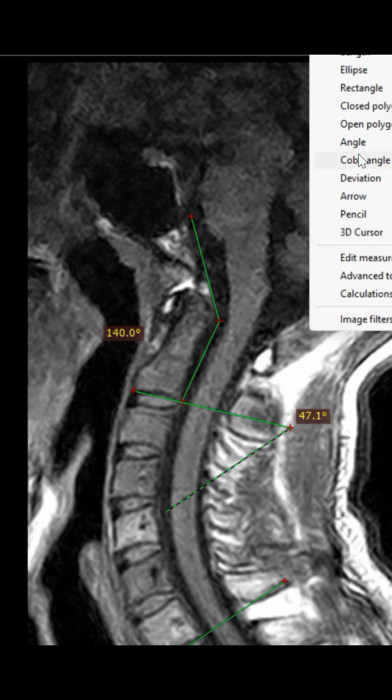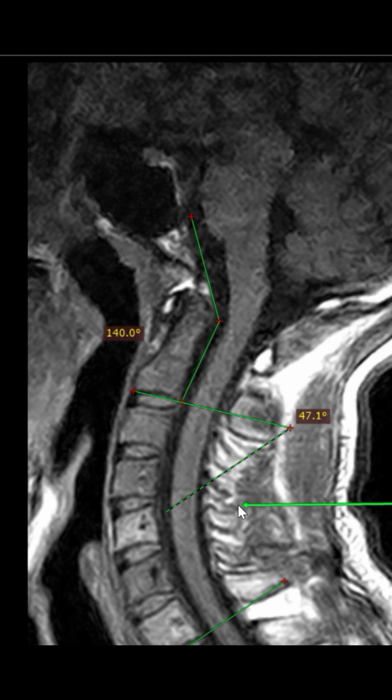And in other cases, we can look at axial angles that are low and in the realm of pathological, but you see these excessive curves in the spine, and whether or not this is compensatory to a problem happening at the cervical junction or habitual, which you can see in many people who are in computer type jobs. They can hinge at the neck excessively, perhaps even scarring up tissue here, fibrotically causing tissue to scar up in that position, and therefore having an excessive angle in the neck.